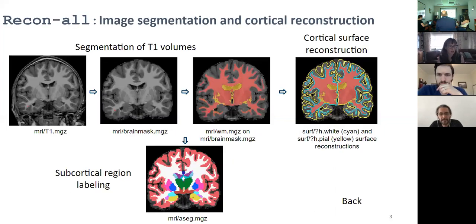It looks like you'd have to go in brain by brain and adjust. Right, this might be part of the thing that Jason hasn't explained yet, about how to edit these things manually when you have any troubles with it. Because I have no idea how to, but we might get to that at some point. We will not get to that today. Not today, I think, right.